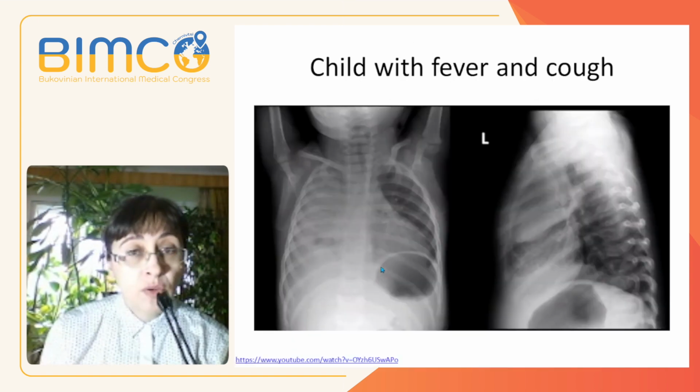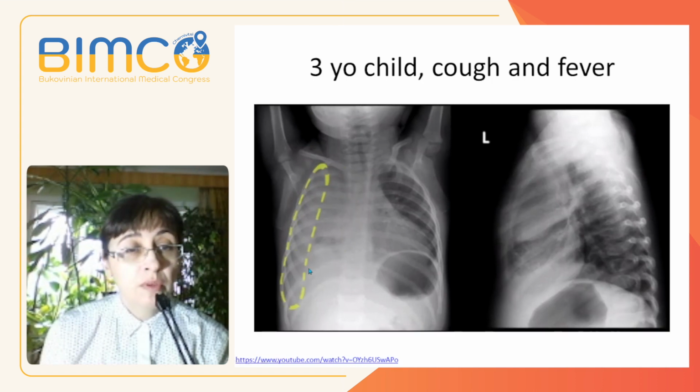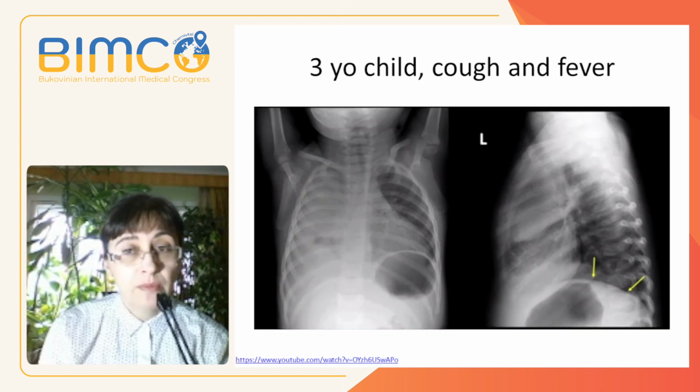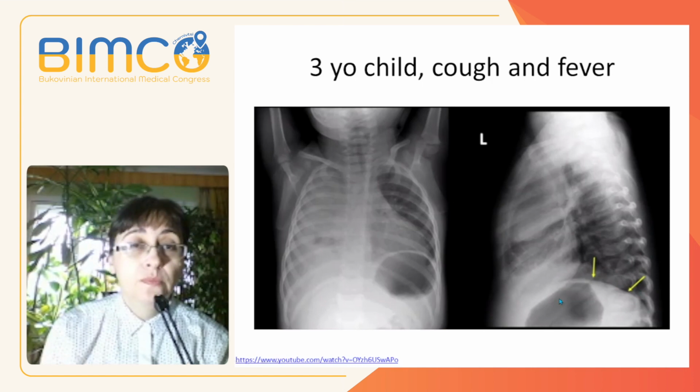A child with fever and cough comes to you with such complaints, and you decide to take a chest X-ray because of suspected pneumonia. You may observe consolidation involving almost the whole right lung, which tells you that you suspect pneumonia, but you may also observe a laterally more dense opacity, which tells you about the possibility of a complication like pleural effusion, confirmed by visualization of only one hemidiaphragm on the lateral view.